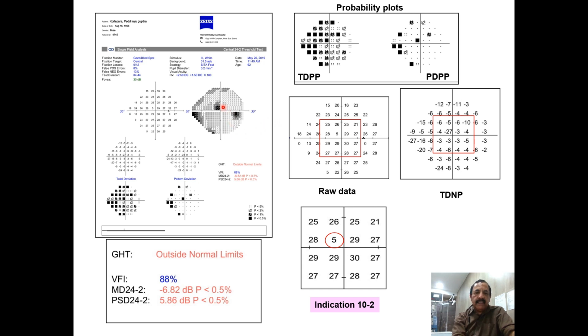The same thing is seen in the grayscale. That means it's a multicentric origin of glaucoma. And now we analyze these 2 scotomas separately. This one outside the 10-degree field is showing a deep scotoma of -27 and started from the periphery toward the center. And if you analyze the field defect in the center, the 3-degree point is actually showing -27.